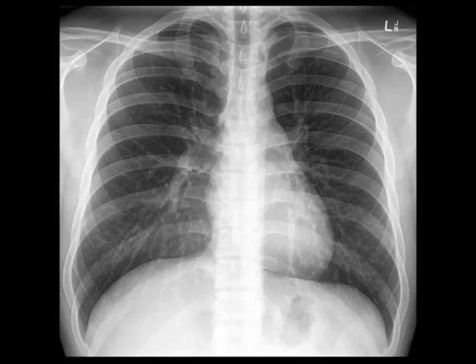Now, before we jump into how to analyse a chest X-ray, I'm going to talk you through how I would present a normal one to a colleague. This is an ideal scenario where we assume that we have the patient's information and we know what kind of radiograph it is. This is an upright PA film of Mr. Duffy, taken on the 1st of January this year.